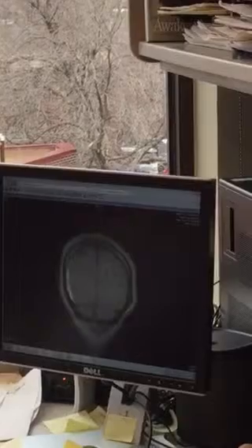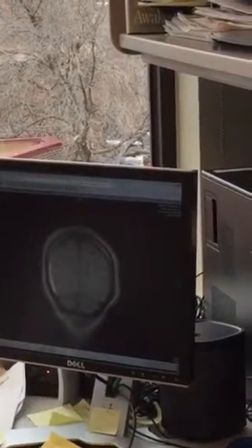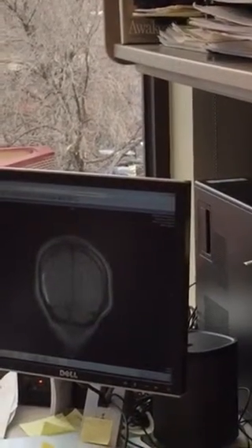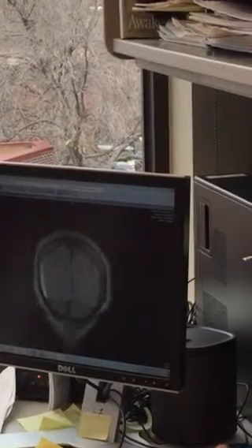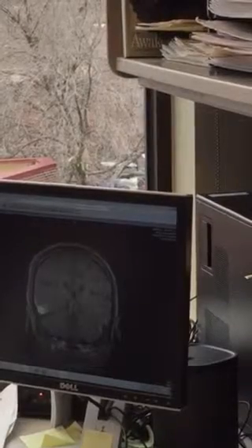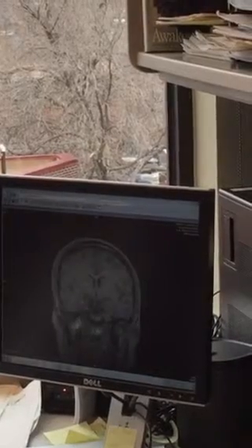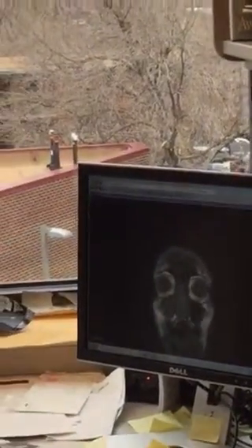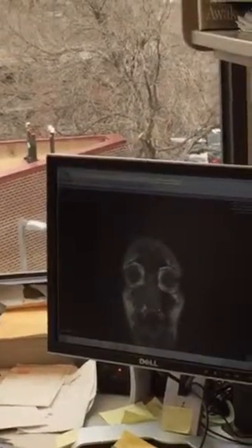Again, you've got this blood accumulation. This is vertical again, over here on the right. Can you see that okay? So we'll start from the back and we'll go forward. There, you got a little bit of accumulation there. There, and some more there. Here. And there's your nose. It's like a little fetus.